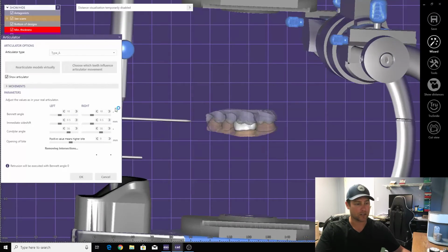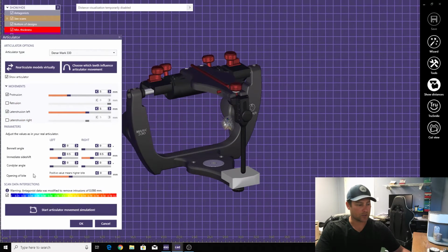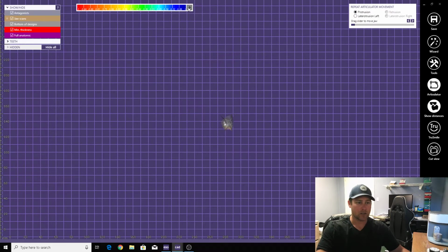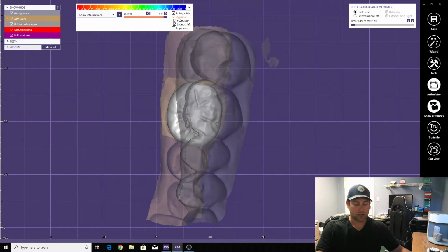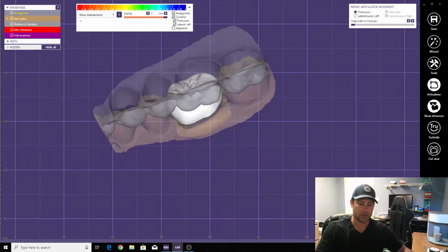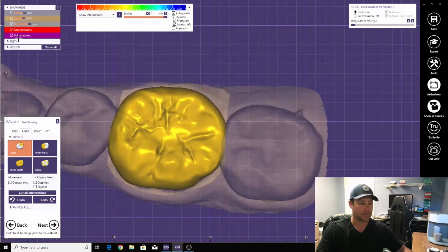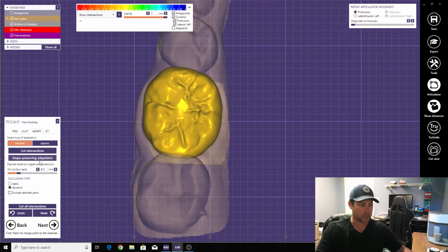Go ahead and cut everything. I do retrusion to the right. Start. Okay, save this path. Double click this. It's not going to load in. I don't know why. It's just some kind of glitch. Just double click it and it will show up if there are any marks to be had, which there are not, but I will go ahead and cut it anyways, just out of habit.